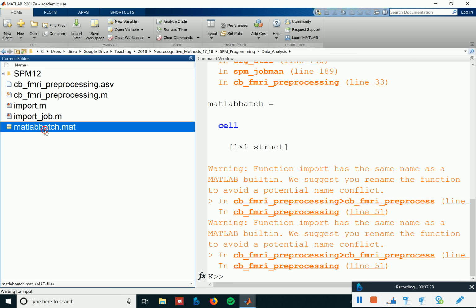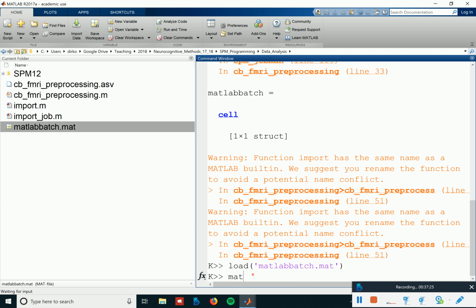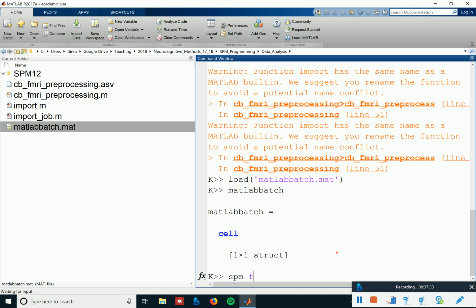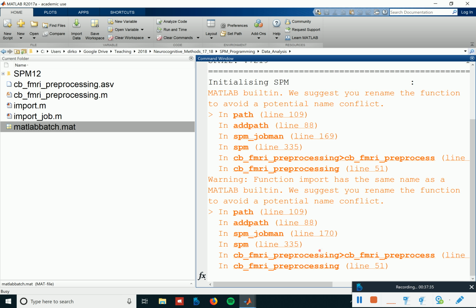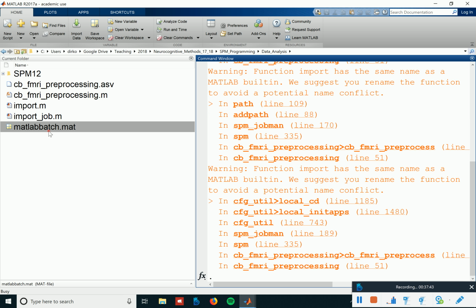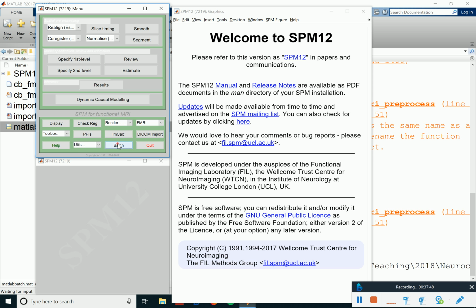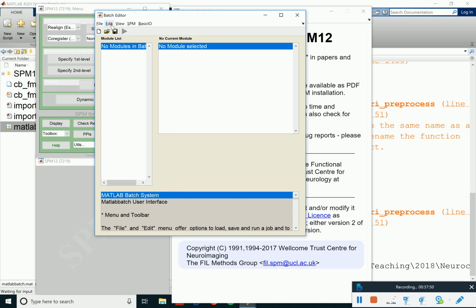So now we hopefully have a better version of that. So let's see again. This is what I recommend to do for the debugging, to investigate, especially if you're doing it this way, what you might not have specified, because then in the SPM batch editor you can easily see that. Oh no, load batch.